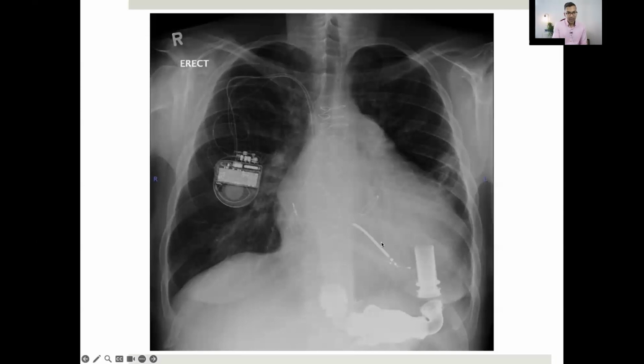What makes you think it's an AICD? It's the thick portion to the wire in the sort of left ventricular portion. Yeah, great. And I like what you did. You said, look, there's an obvious device here, and you mentioned it's large. You mentioned the location. So you're telling me true statements.